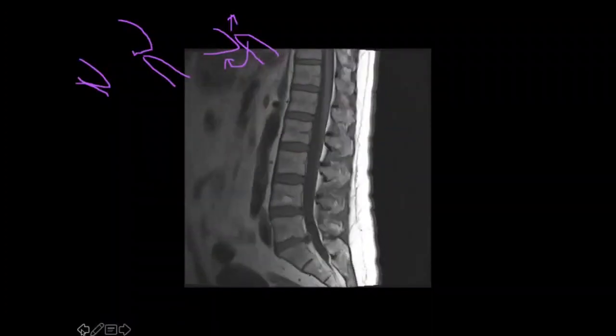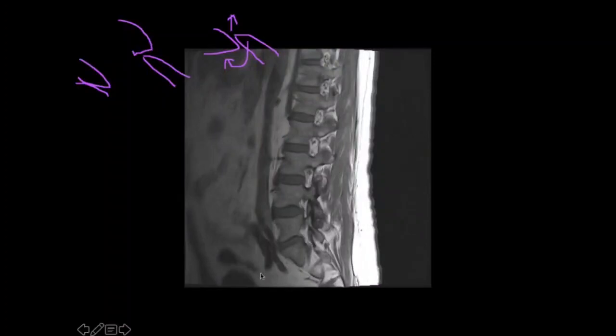Spondylolysis without listhesis at times becomes difficult to diagnose on MR. Is there any technique to see it? Well, the important thing is that on the sagittal image, you are looking at the pars interarticularis. That's a superior articular facet, that's an inferior articular facet, and you're looking at the pars interarticularis.